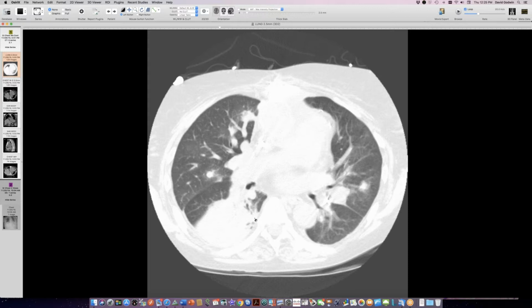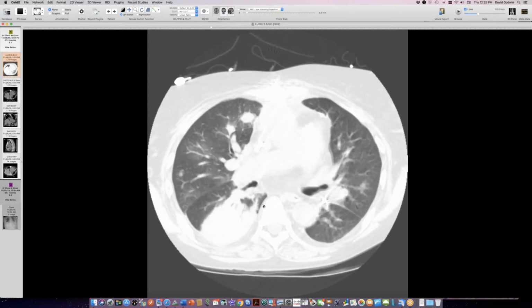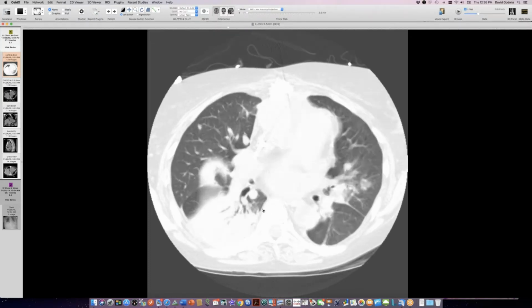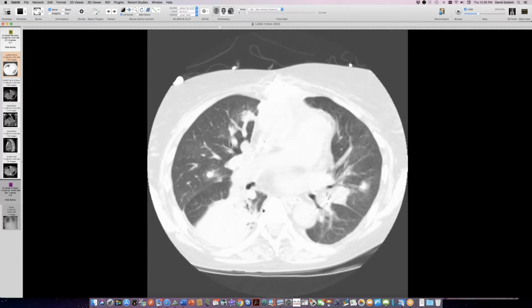And this turns out to be nocardia nova. So last week, Jeff showed a case of a very smooth, single lesion in the right lower lobe that was a nocardia species. And this is also nocardia. So it's not a very good pattern for Aspergillus. So I had PTLD in mind, and I also allowed the possibility of nocardia. So nocardia is what it turned out to be.